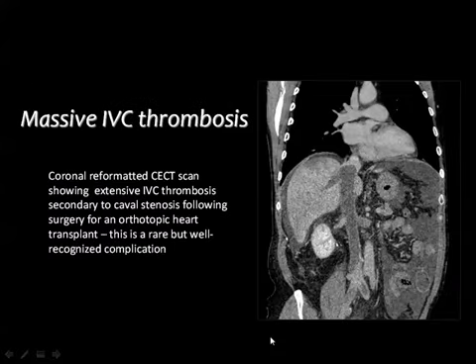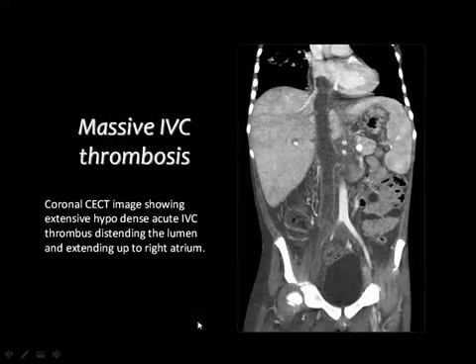And the difference is more between malignant thrombus and bland thrombus. The bland thrombus does not expand the lumen of the vessel. The bland thrombus does not enhance. The bland thrombus does not extend outside the vascular lumen. The bland thrombus has characteristic signal intensities on MRI, with T1 and T2 signals being those of acute blood.